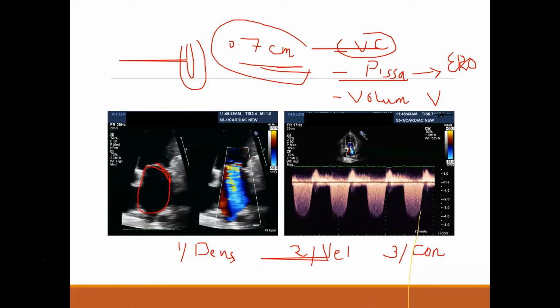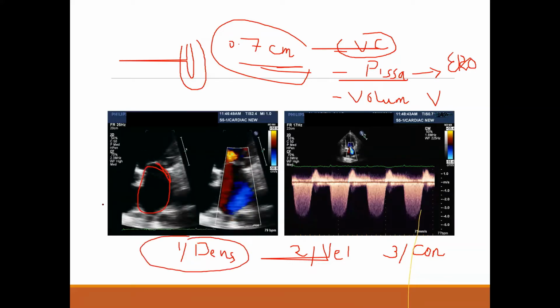Triangular. Now the density, does it tell you anything? The more dense, the more likely to be severe, but with a pinch of salt. Density is not about the severity alone, but about where you are putting your interrogation line.